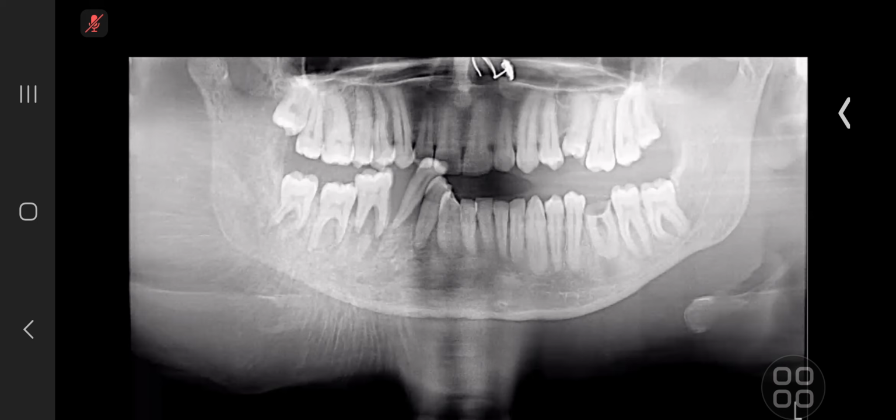I think to assess the soft tissues, the patient should have an MRI of this area. A CT may also be useful just to further assess the underlying bone and to see whether there's any bony abnormalities relating to the teeth. And I think there are periosteal reactions. There is some element of calcification there. Again, the CT will help to determine the distribution of that.